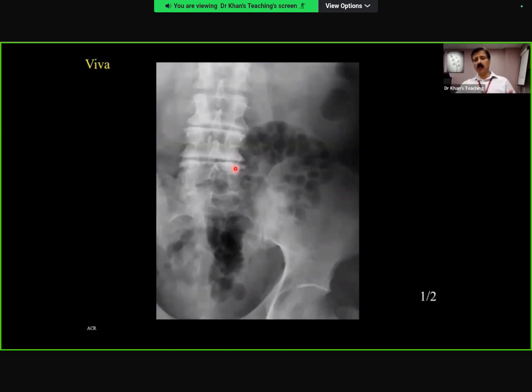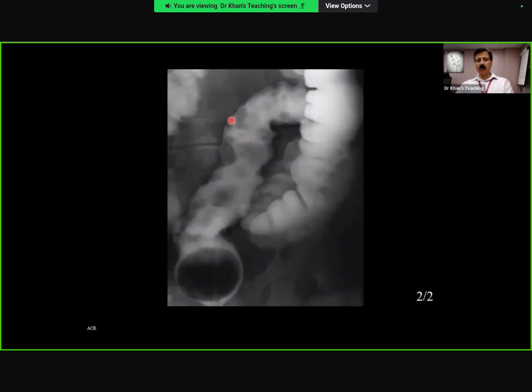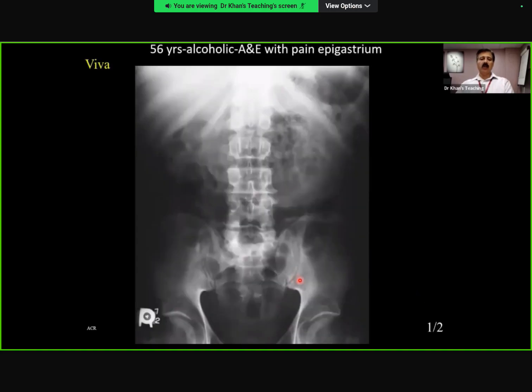But of course, for that, you need a software, a DICOM viewer to pick it up. And so remember this. When these air bubbles burst, the patient might develop pneumoperitoneum without any peritonitis. So we use that phrase, pneumoperitoneum without peritonitis. The patient will be absolutely fine. So this is idiopathic pneumatosis intestinalis.